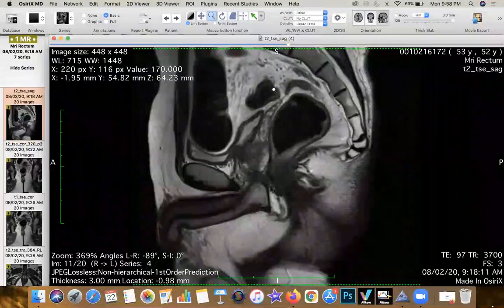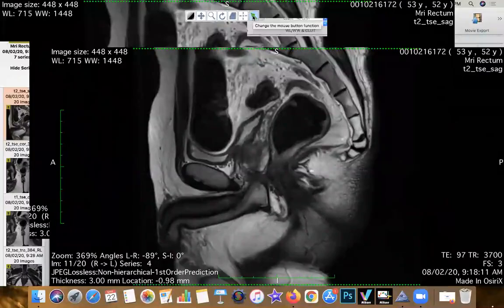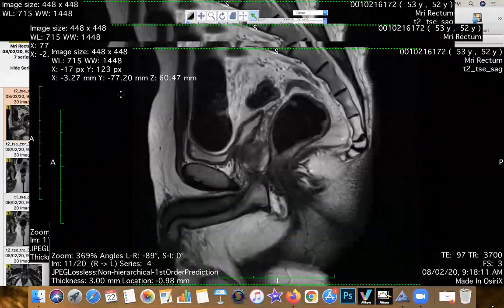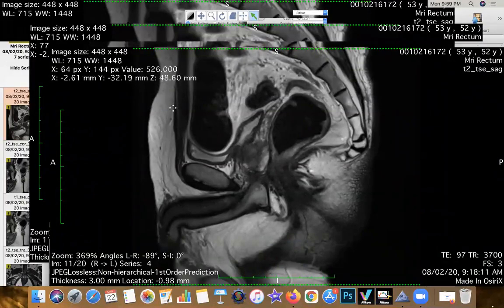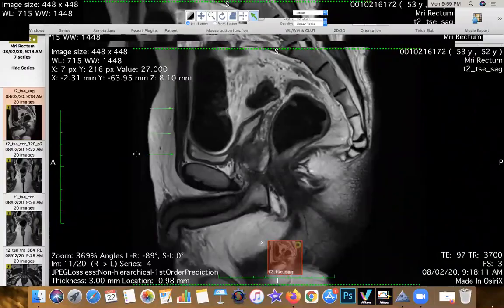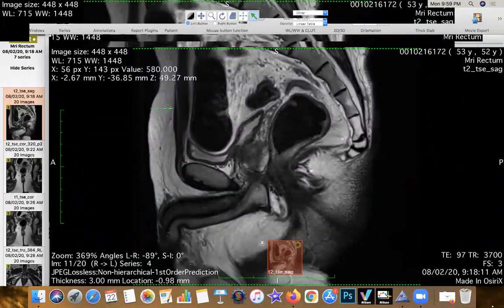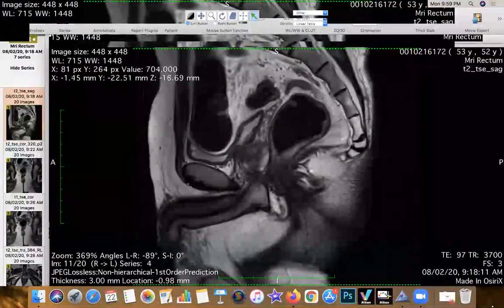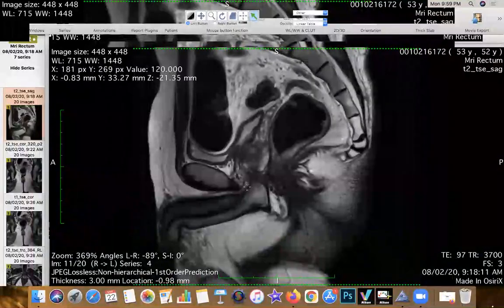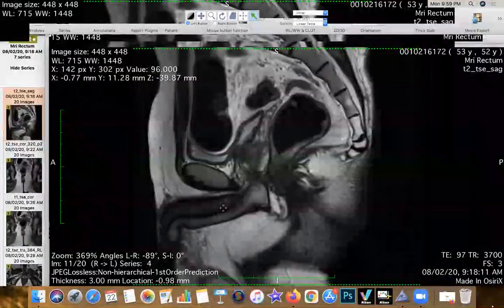Just for a second, I'll identify all the key structures so that you know what we're looking at. This is the anterior parietes, the infraumbilical anterior parietes. There are two fascial layers located along the ventral aspect of this, respectively Camper and Scarpa. I've just explained that to you all. The Scarpa is contiguous and goes down below along with the Colles fascia. The Colles fascia envelops the scrotum and the penile structures with the dartos fascia.